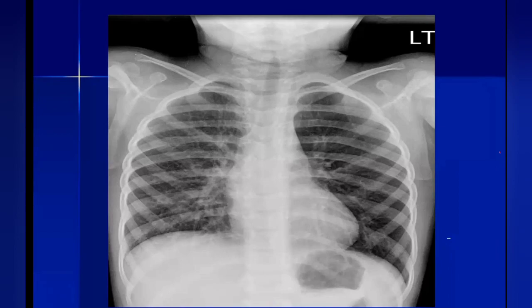So it's again important, Dr. Shahzad, that we always compare the lungs, the lateral decubitus sides. The history also is very important. If the family says he's fine, no fever, nothing, he's playing with nuts or some toys, then all of a sudden he starts coughing. So always check the history very well. It's very important to communicate with the ER and the clinics, if the patient is coming from the clinic, to ask about detailed history, and also to check the asymmetry.